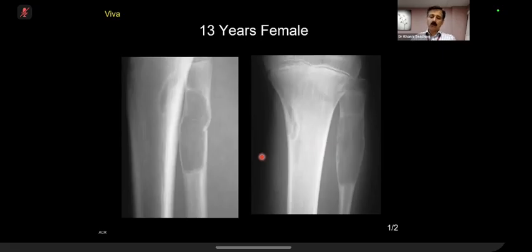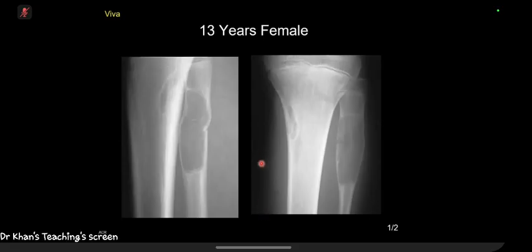Candidate 4, your next case. So I've got a frontal radiograph of the proximal tibia and fibula in a skeletally immature female, and I can see a lucent intramedullary lesion within the proximal diaphysis of the fibula. There's no surrounding periosteal reaction, no cortical breach, no associated soft tissue swelling, so it has a narrow zone of transition.